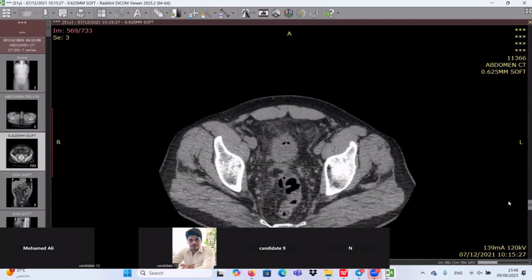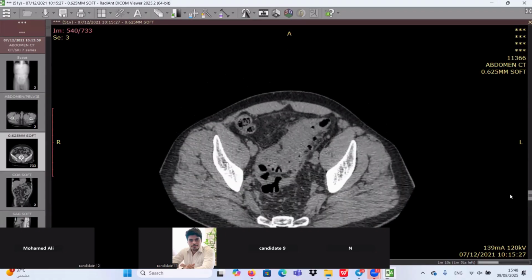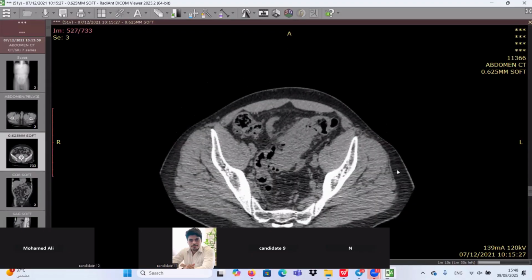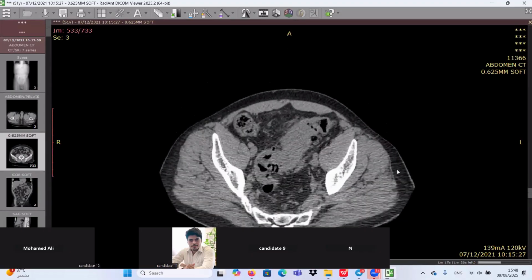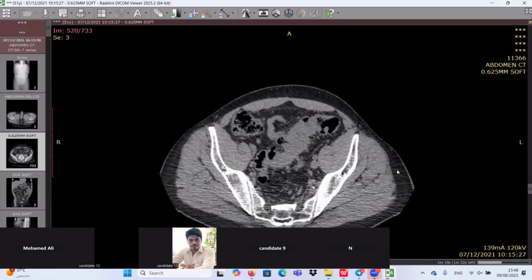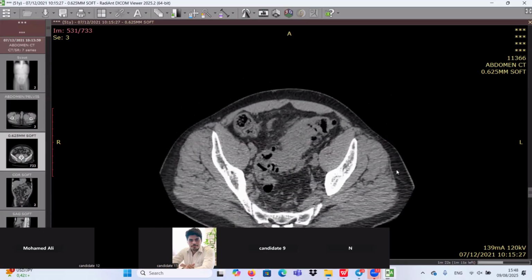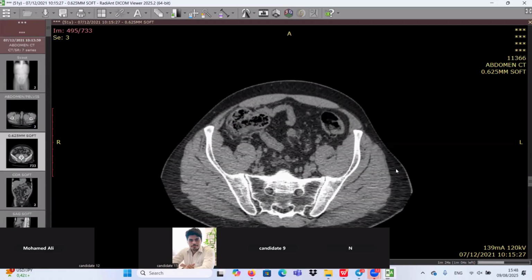There is significant fat smudging within the pelvic cavity, and also there is a long segment of the sigmoid colon that appeared to have mural wall thickening and wall diverticulosis with the associated surrounding eccentric fat stranding.